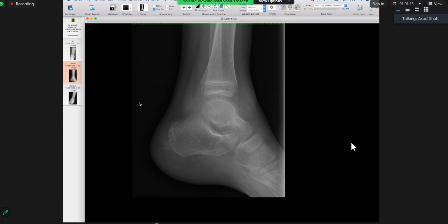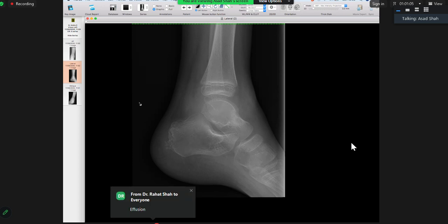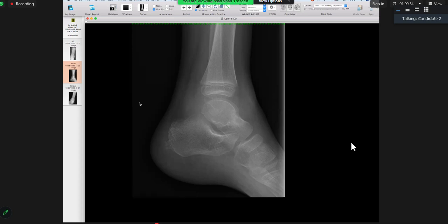So you will be able to identify if there is an ankle effusion, and if there is any synovial thickening with marked increased vascularity, i.e. synovitis, isn't it? Because the two things you are thinking about here are what? What are the two differentials on the basis of this X-ray? The soft tissue thickening surrounding the joint is likely favoring joint effusion, and can you think about any joint pathology that kids can get?